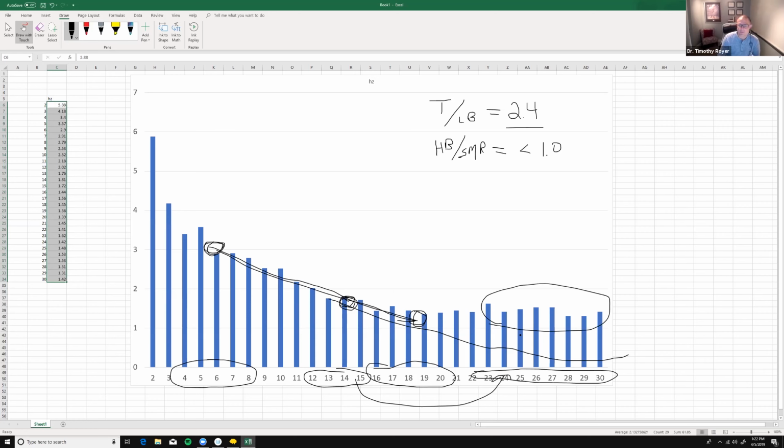So for me, I can look at this and I can say the biomarker in relation to stress is really higher right now, which makes sense, I'm doing a webinar, trying to get the technology to all work, all that kind of stuff, right? And when I look at my EEG, I don't have to tell you, okay, I feel a little bit stressed, or maybe I don't feel stressed. I can look at my EEG and say, that distribution is not correct for a healthy EEG.